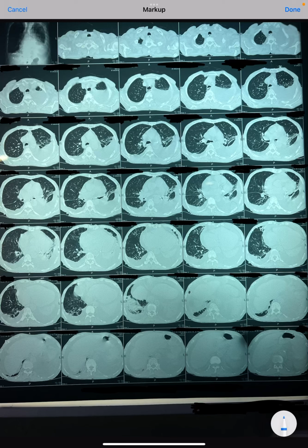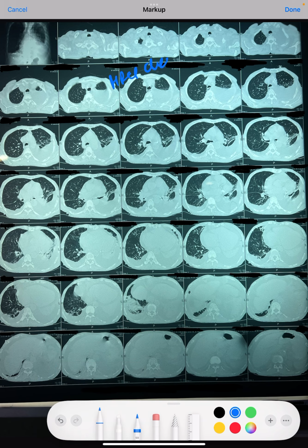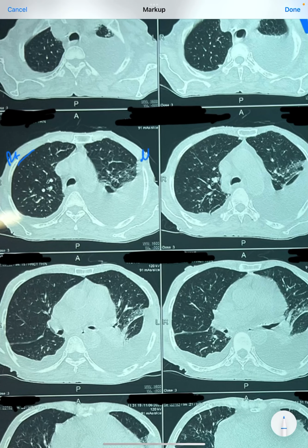So today we'll be discussing a very interesting topic in the HRCT chest, and that is pleural effusion and finding the possible underlying cause. Now the first thing is this is HRCT chest because this is right side, this is left side, and this is all lungs.